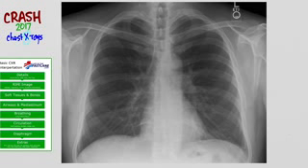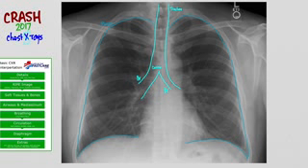So let's start first with the PA and identify all the structures on here. First, how about the trachea, the airways? So you can see here the trachea, and it splits into the two bronchi, and this splitting point here is called the carina. Next, I'll trace the pleura, and that's a lining of the lung as it gets up to the chest wall. And then there are also the various fissures that separate the lobes of the lung, like the horizontal fissure here, as well as the oblique fissure, and then there's another oblique fissure here on the left side.